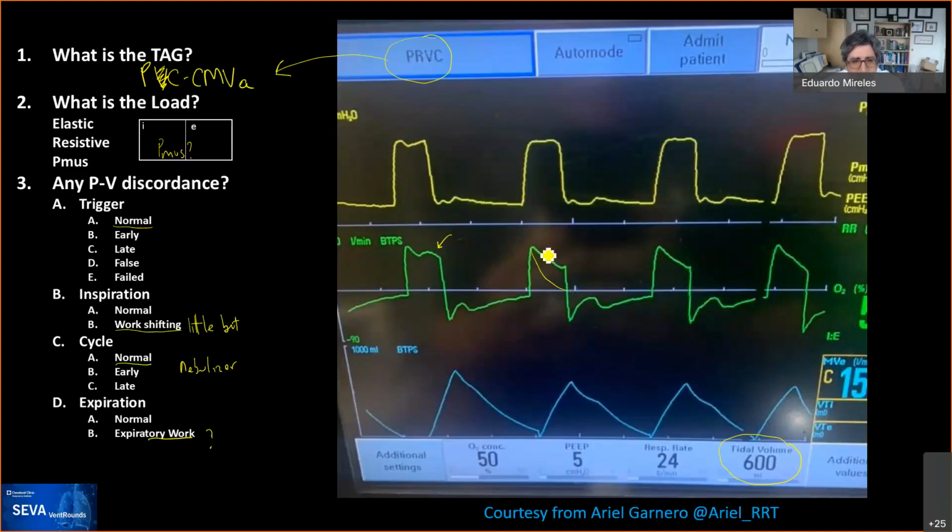And during those 0.7 seconds, this waveform didn't reach the baseline. Actually, it has a little hump here, but here, it's definitely different than the others. You can see that this one should look like that, just to mimic the other ones that are pretty similar.